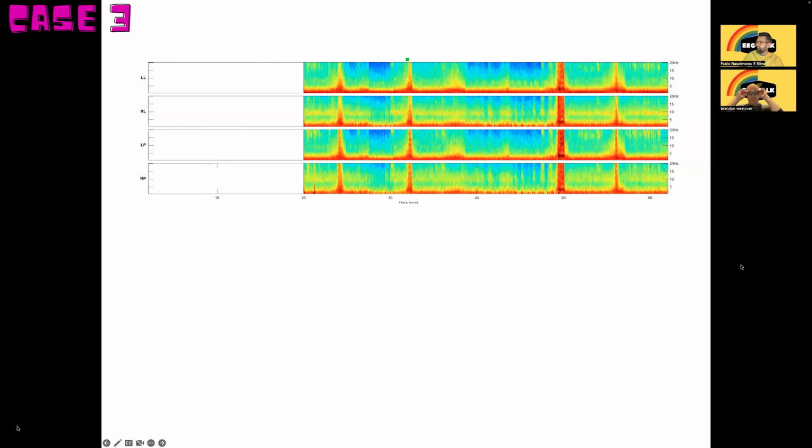This one. Okay. Tell me about this one. So this was connected at the 20-minute mark. Start with that. It looks like a flame too. What kind of flame? It still looks pretty regular, I think. Regular flame. Yeah. But maybe the upgoing slope is faster than the downgoing slope this time around, maybe? Maybe. Hard to say, right? Yeah. I think this one goes woo.